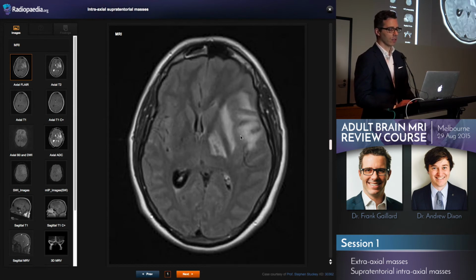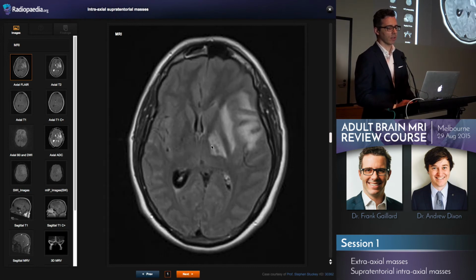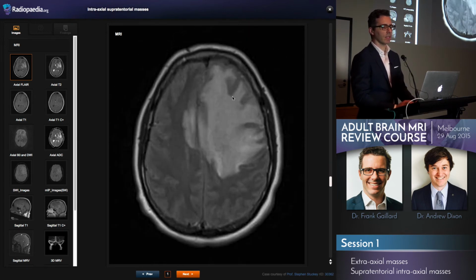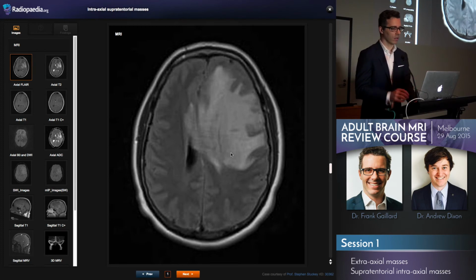So what are the clues? Well, firstly, we saw in the previous one where the grey matter was involved. Here it's really looking at a white matter process. Both the demyelination and the edema is confined to the white matter. So it's spreading along white matter tracts, sparing the deep grey matter structures, but spreading along the posterior limb of the internal capsule. And the vasogenic pattern of edema is really quite striking, with complete sparing of the overlying cortex. It can spread across the corpus callosum, so that's why it's on the differential for those corpus callosal lesions.